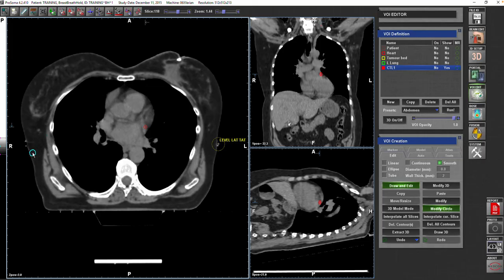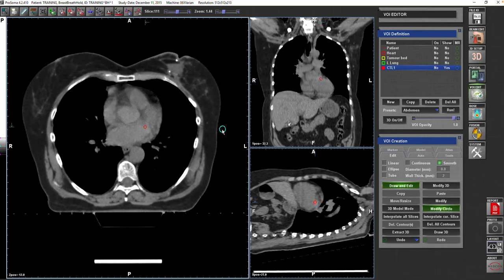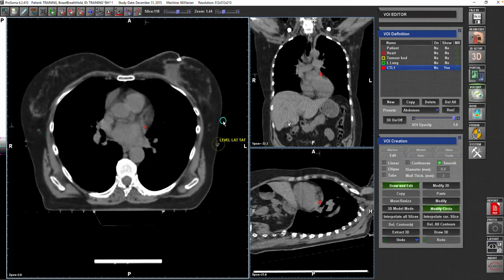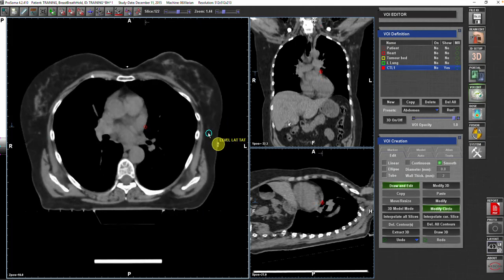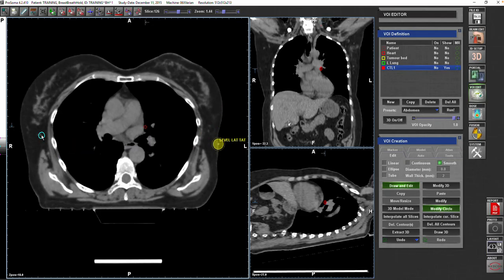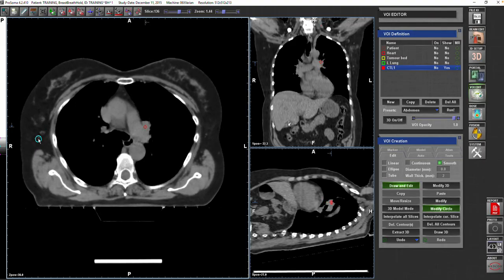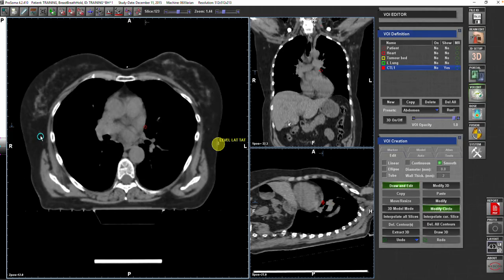But in the modification, they told us that if you can see the breast tissue well demarcated, and you can see that the breast configuration is very clear, you don't have to follow the vessels, because sometimes it's located more posteriorly than it should be. But it is something that you need to be aware of, something that I would like you to familiarize yourself with.